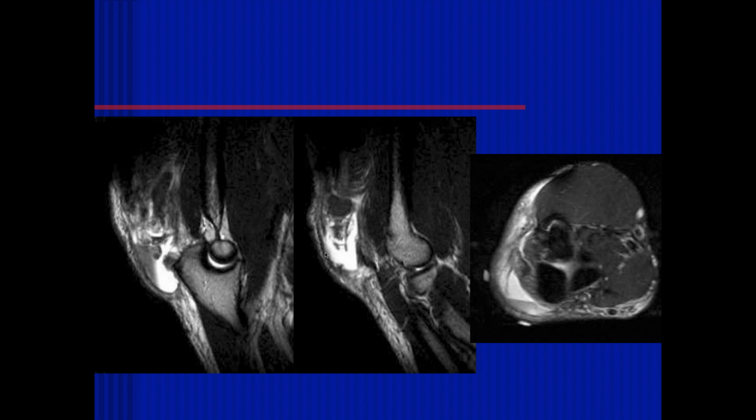The triceps. I don't see the triceps very well. I guess this could also be. This is a complete tear. Yeah.